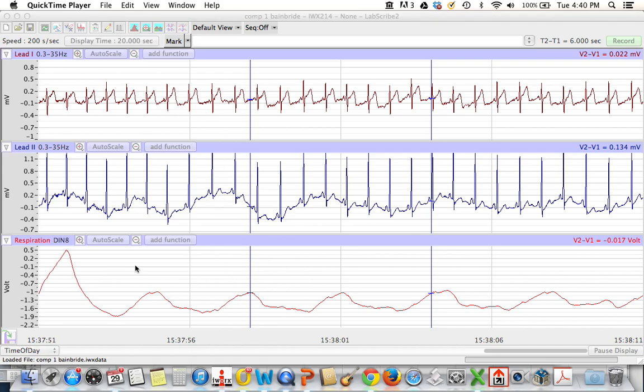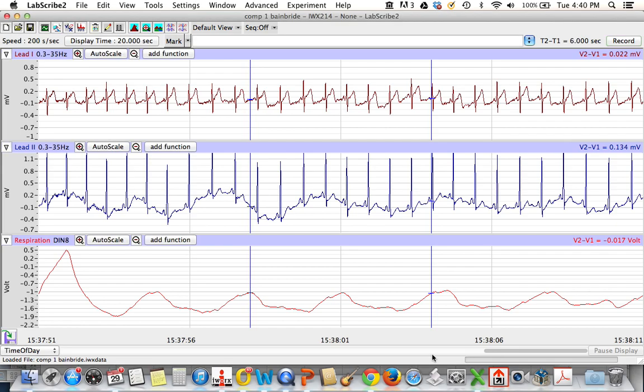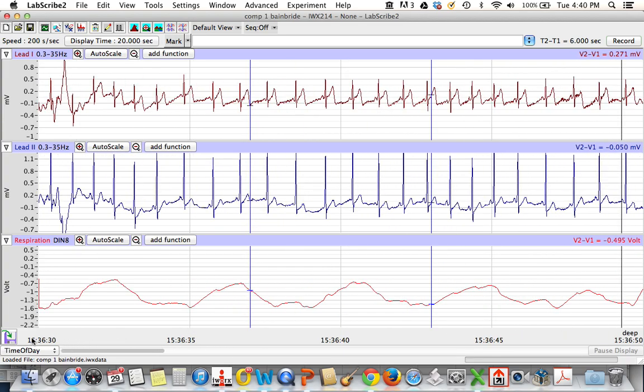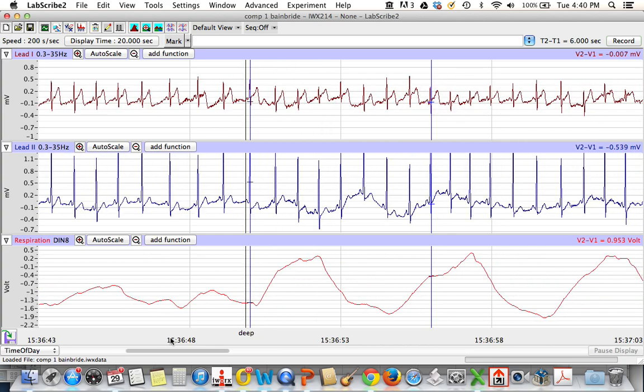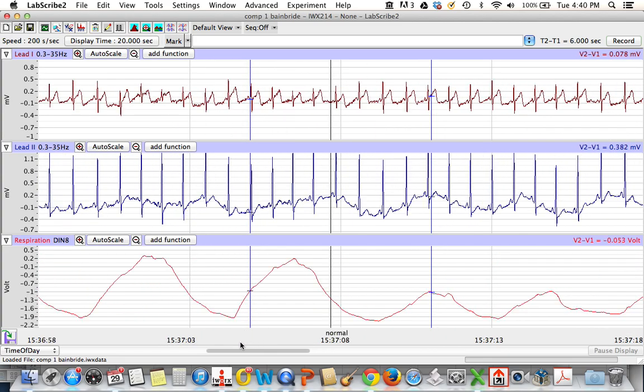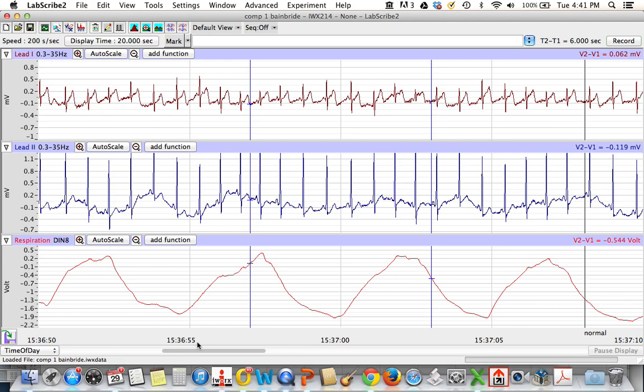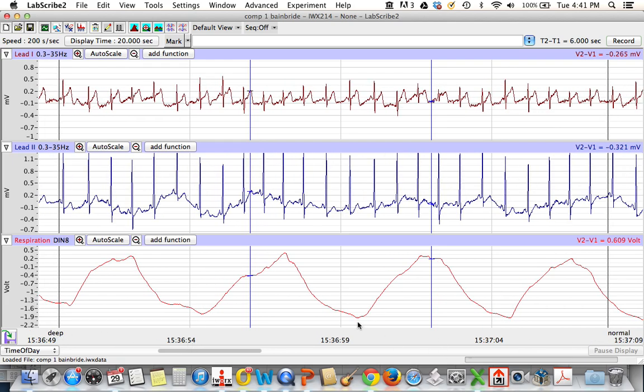And you can tell when the breathing started by looking at the bottom trace, usually. Sometimes they would have marked it, that's always helpful, but sometimes they didn't. And if it's really obvious, then it's not bad. But so let's see, I see deep breathing done here. So what you can do then is look at this deep breathing that happened between when they started the deep breathing and when it went back to normal. So let's do our deep breathing and choose 10 seconds out of this. So we'll start here, end it there. There's our 10-second window.